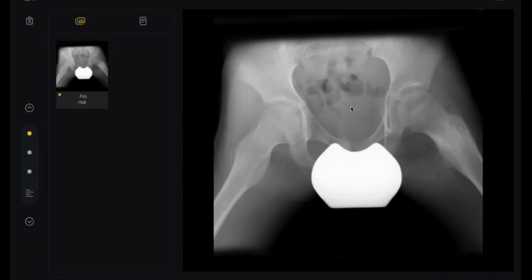I cannot see any periosteal reaction. Also, I cannot see any cortical breakdown, and also there is no matrix calcification or chondroid matrix. Appearances are mostly those of a non-aggressive lesion. In my routine practice, I want to see the other views if available. No other view.